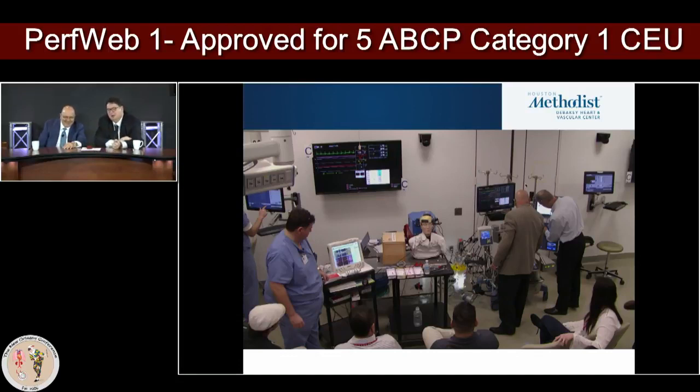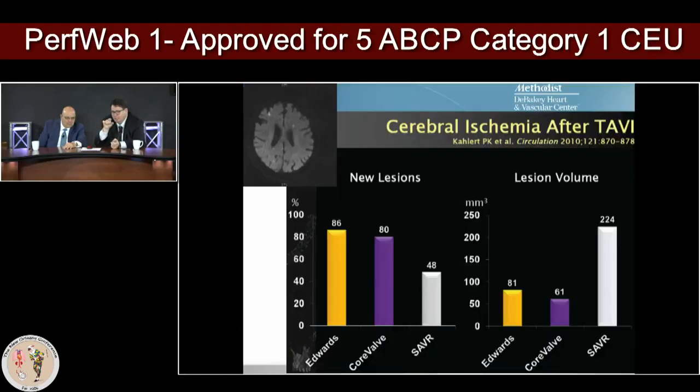The handsome guy in the middle is our NASA head frame that NASA gave us, and we're able to use that as a cerebral perfusion model for the TCD. The TCD is sitting on that head, and while you guys are hooking up your pump, we were perfusing our head model, and we have a TCD signal placed on the head.